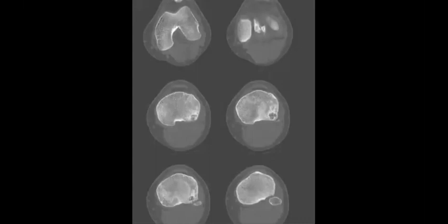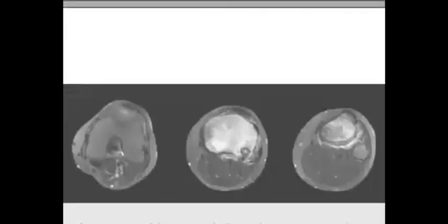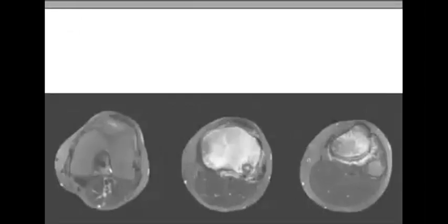Let me show you something in this patient. Yes, the MRI of this patient, this is some selected images in the tibia, and I think it's good to describe it again with marrow edema, nice, and the rim is sclerotic.